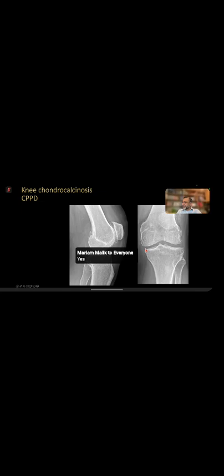Faint calcification in the cartilage as well. Very faint, but definitely the posterior meniscus is calcified, which is a fibrocartilage. Maybe some calcification in the synovium, okay? Sometimes it doesn't project very well, but I'm sure you can see some calcification there. So you can look around somewhere and confirm that there's calcification in the body. You don't have to do anything else, just confirm that this is CPPD.